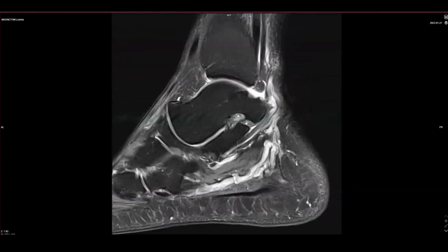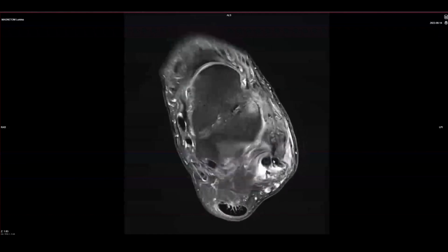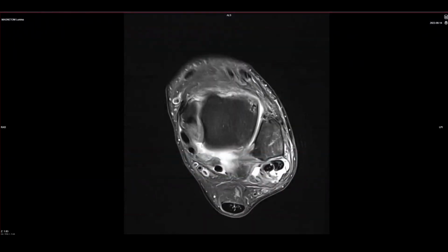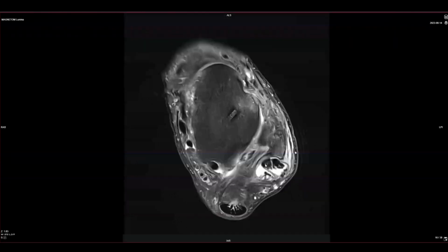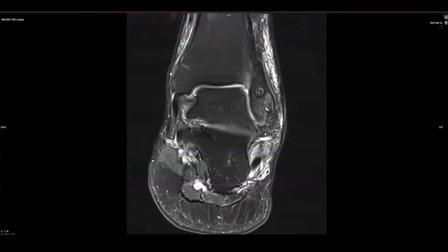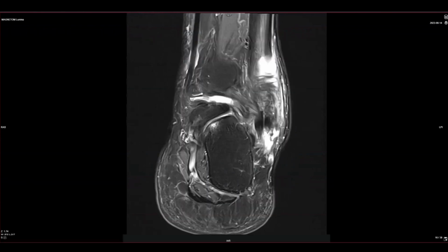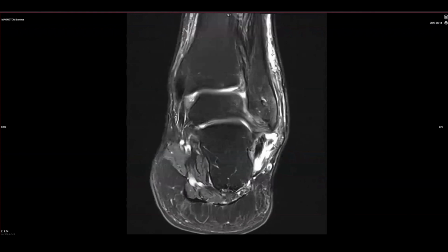Okay, so moving on to our peroneal tubularization procedure, which is something that they do when the peroneus brevis tear is 50%. And they can create a wrapping around the peroneus longus and reinforce the tendon. Looking at where they do the procedure, or where it was done here, how many sutures they put in, I'm not exactly sure, but I'm looking at the peroneus longus and the brevis here, and I get to this part here where I see that there's some bogginess to the tendon.